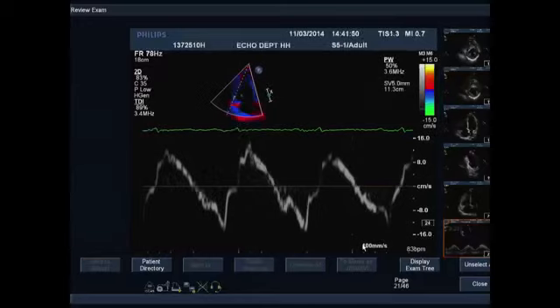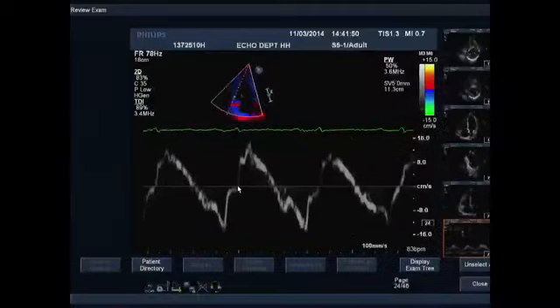And this is very important because it gives us a lot of information and measurements from the cardiac cycle. In fact, we will be able to detect from this waveform the isovolumic contraction time of the right ventricle, the ejection time of the right ventricle, the isovolumic relaxation time, which will be prolonged in patients with pulmonary hypertension, and then the E' and A' waves.